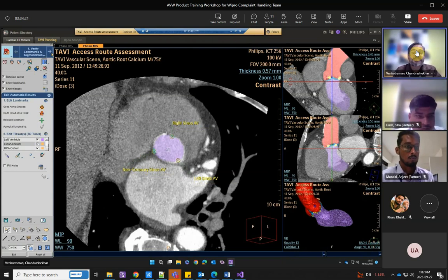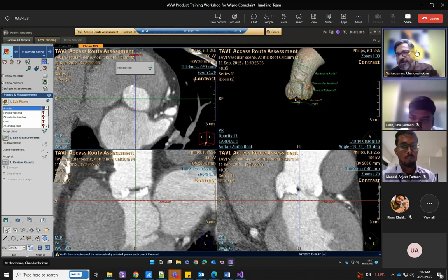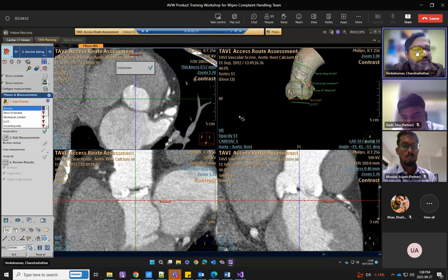Let's just go to the next stage, where the real work happens. Here now you can see this is where the implants, the catheters, are actually placed. So they have to plan where this has to be located. This also has various parts: the ascending aorta, which is the top part, and then the sinotubular junction, sinus of Valsalva, annulus, LVOT. There are many names for them also.